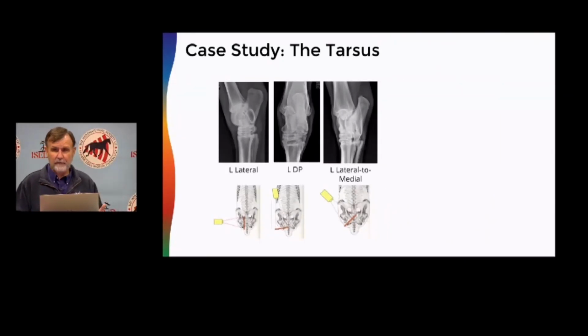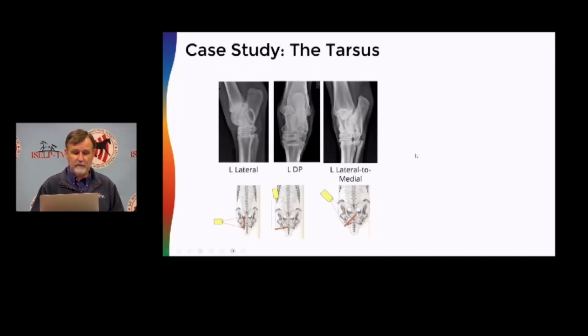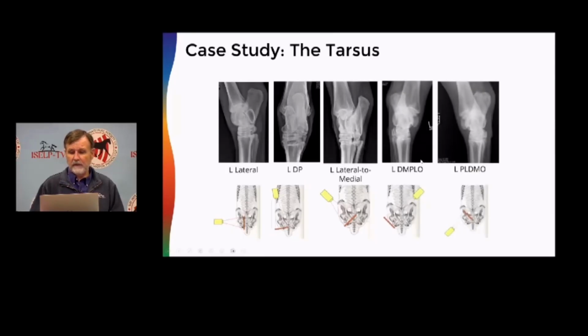Here's also some examples where the software can separate things out. So these are the ways equine practitioners take radiographs of the hocks. This little cartoon is the X-ray generator. The orange line here is a detector panel. And everybody pretty much takes these 3 views the same way. But the other 2 oblique views are taken differently by different practitioners. So some do the medial to lateral oblique this way, truly, and other ones do a plantar to dorsal approach. And our system will tell the difference if it was taken medial to lateral, it is here, versus plantar to dorsal as it is here.